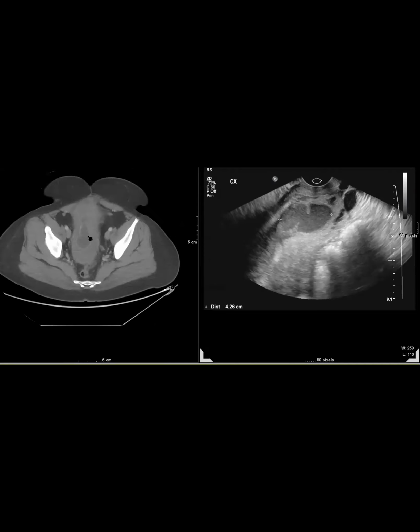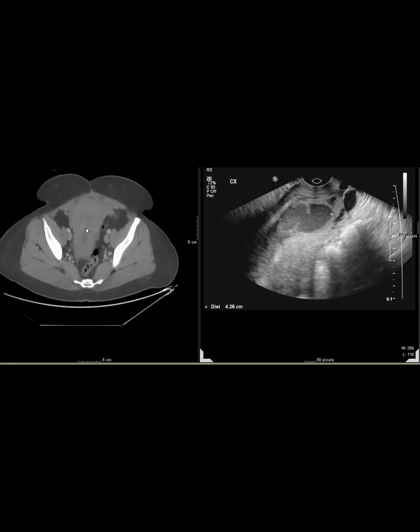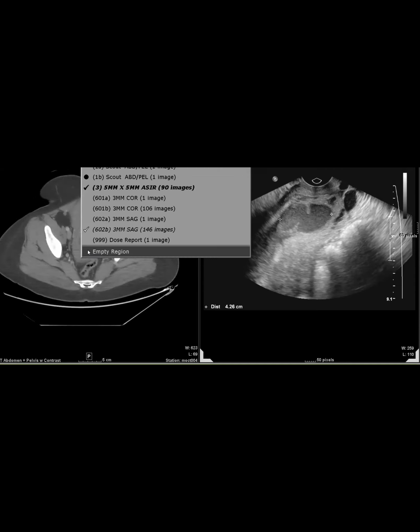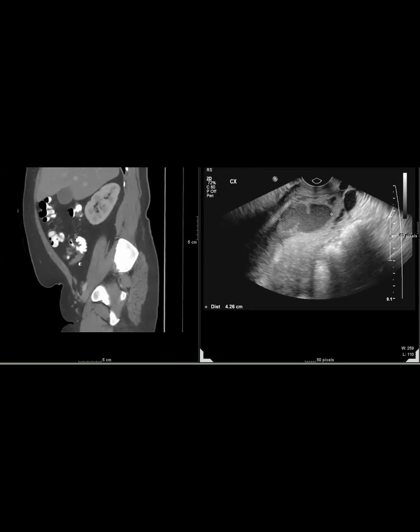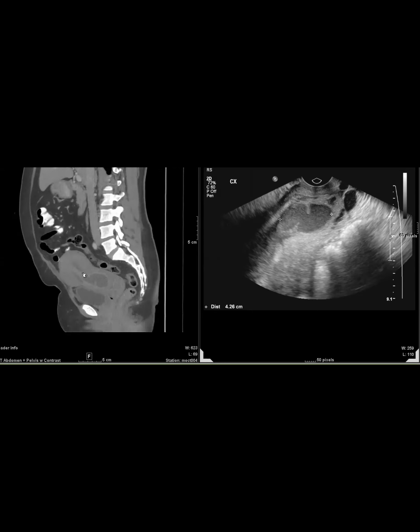Okay. So this was a patient who has this mass. She had her CT for whatever reason. I don't remember what. It was an ED case, and you can see there's a polypoid mass which was extruding, prolapsing into the cervix. You can see it nicely on the. Victoria, maybe just stop there and don't scroll too much so it doesn't freeze. Okay, so here we go. I don't know, it's giving me some sort of exception error. But anyway, you can see this polypoid necrotic mass. You can see very nicely it rises from this part of the endometrial cavity, goes down and extrudes inferiorly.